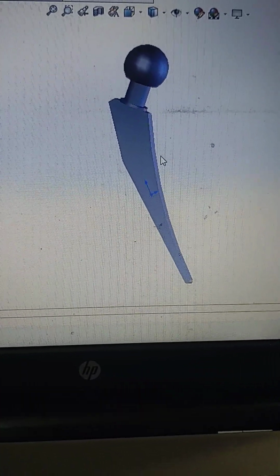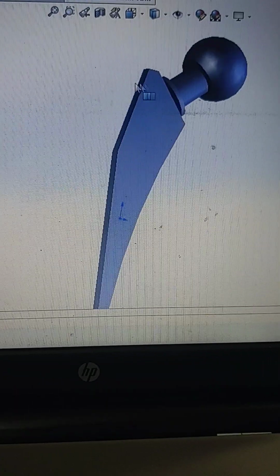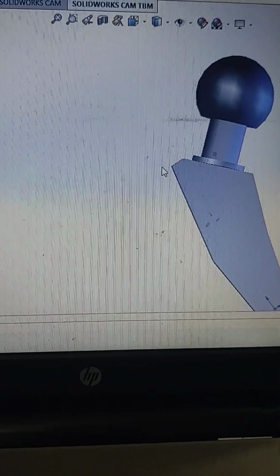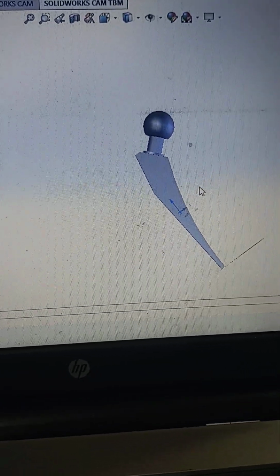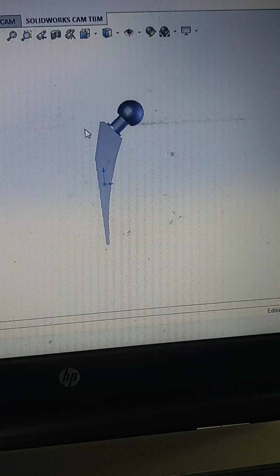Actually, this implant is for patients whose hips are damaged, and this will fix their problem by supplying structural stability and flexural stiffness. You can see there are no sharp edges or corners; they have been rounded with some radius to avoid stress concentration, also known by another name, the singularity effect. So I have also simulated this part.